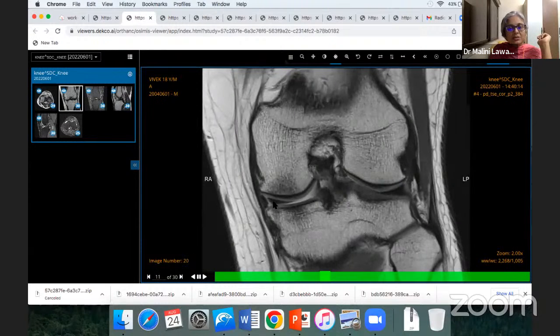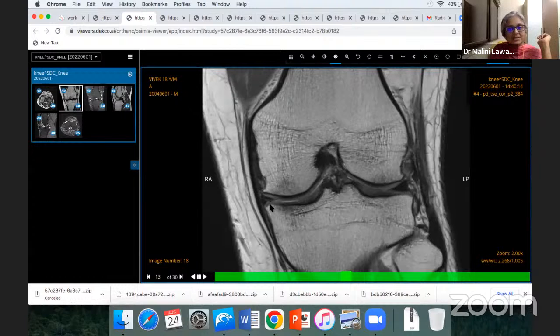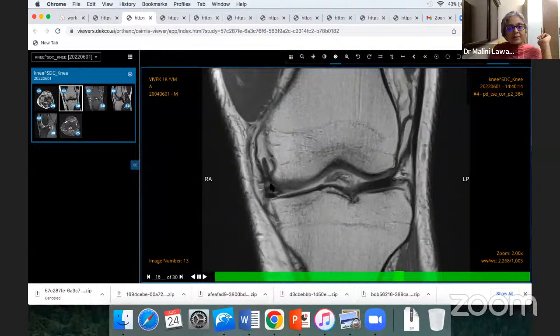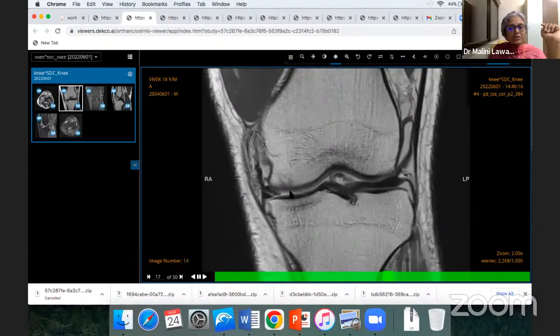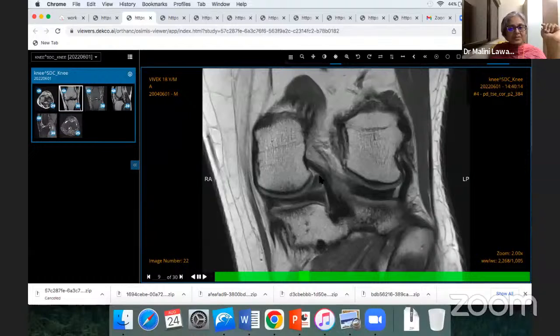And you can see this body is smaller. Look at this body of lateral meniscus, and here it is much smaller. And as you come anteriorly, can you see this flap here? So these are the common locations: the superior gutter, the inferior gutter out here. But remember, this is the meniscofemoral ligament. So always trace. Meniscofemoral ligament you'll see through and through, but this is only at one location. And the other common location is near the root attachment here. You can see this flap-like appearance here.